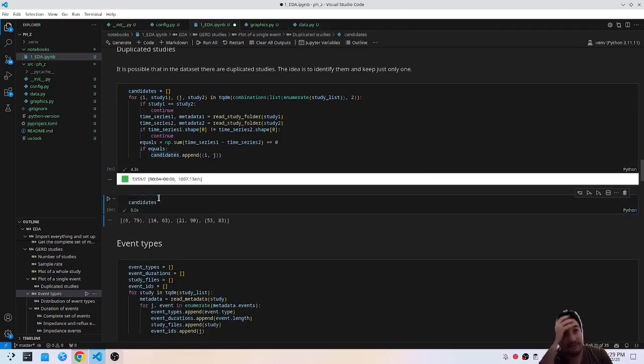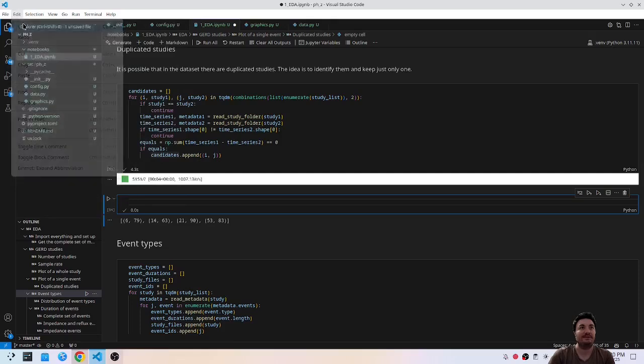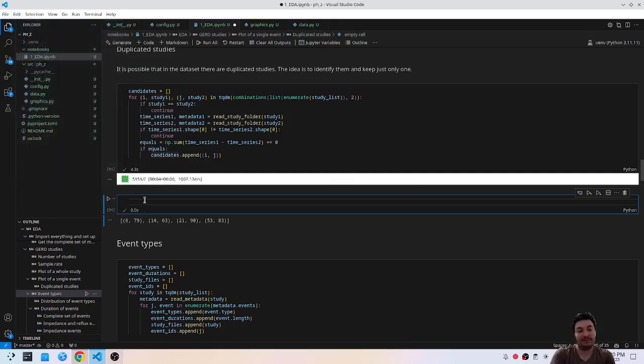Okay, and we have these things 6 and 79, but there are no. Oh, maybe. Oh, I should keep that just as an example. Okay, let's do it again. Let's put example of duplicated study.